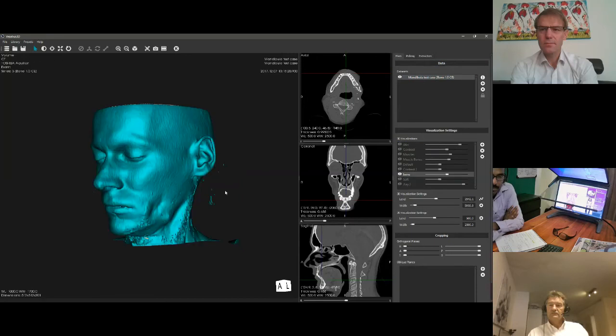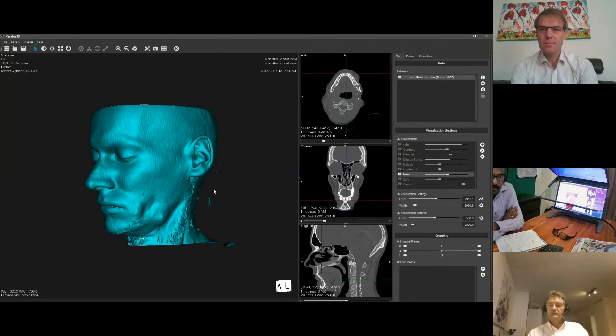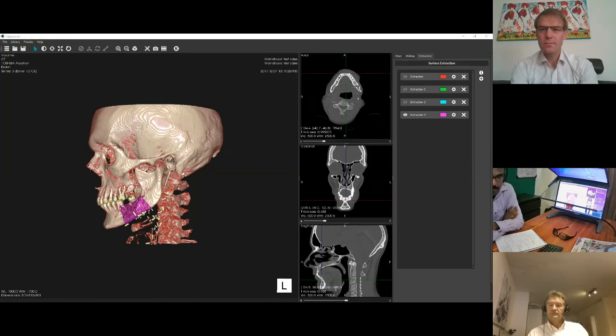And here we have it, and this way you are capable of extracting several segments out of a data set and using them side by side, because it doesn't really matter how many you have, you're capable of using them on the fly, basically. So I hope I've answered the question that was coming to us from the specific visitor to this session.